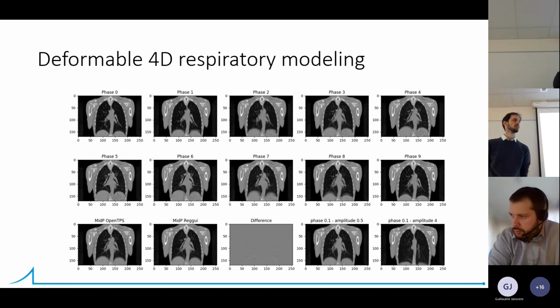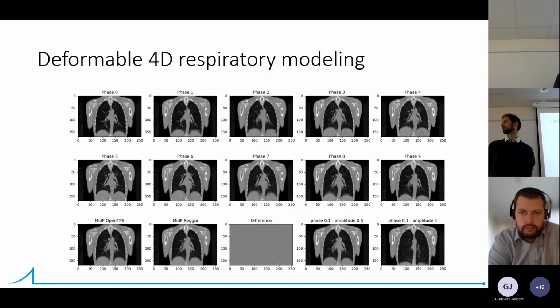Segmentation tools are also available. We used to have learning segmentation in the GUI, but not anymore because of the major refactoring. So I asked if this would be an important feature. You suggested we could do a wish list.